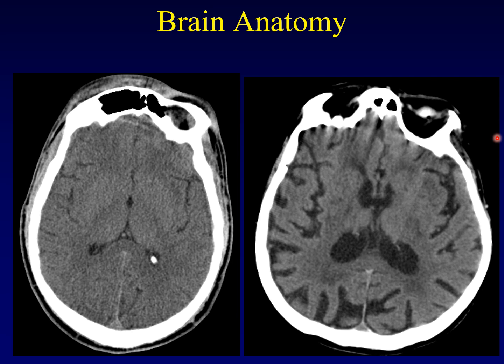So if I saw a 19-year-old whose brain looked like this, I would think that's strikingly abnormal. But if I saw a 90-year-old whose brain looked like this, that would also be strikingly abnormal. Each of these is normal for that person's age.